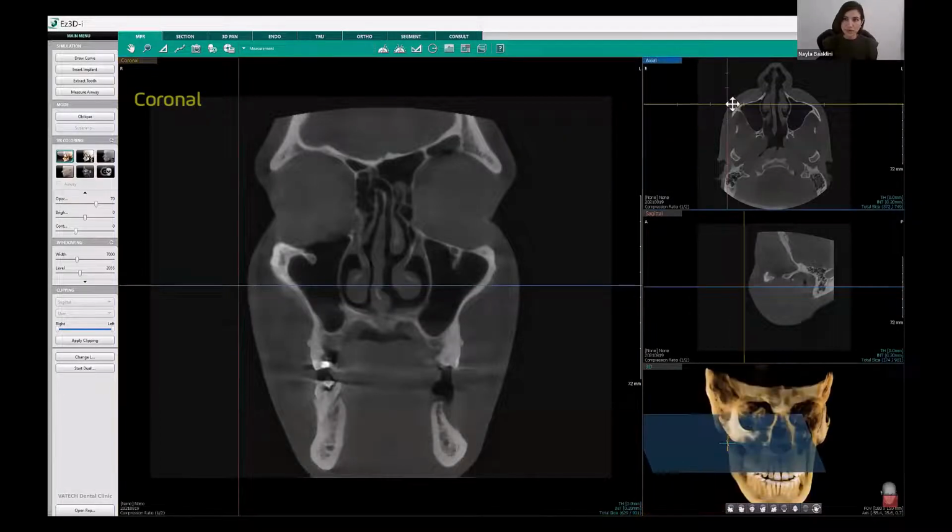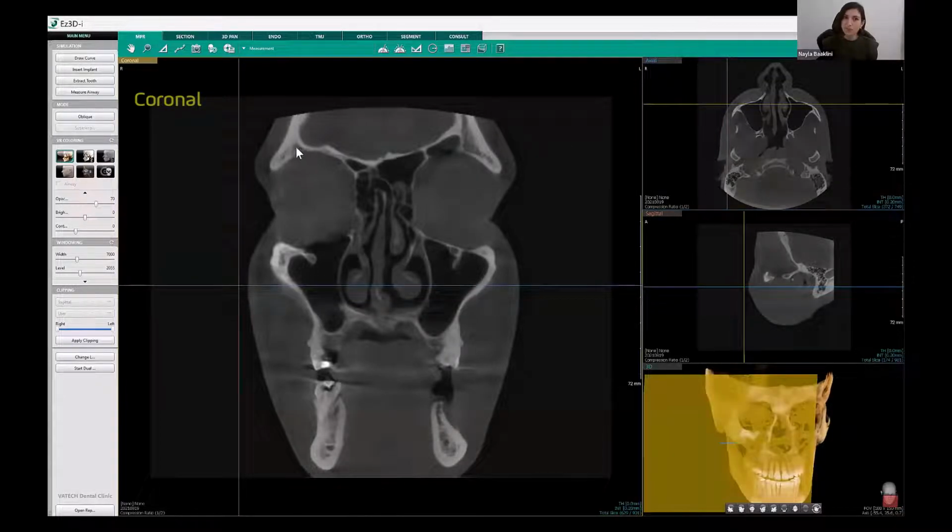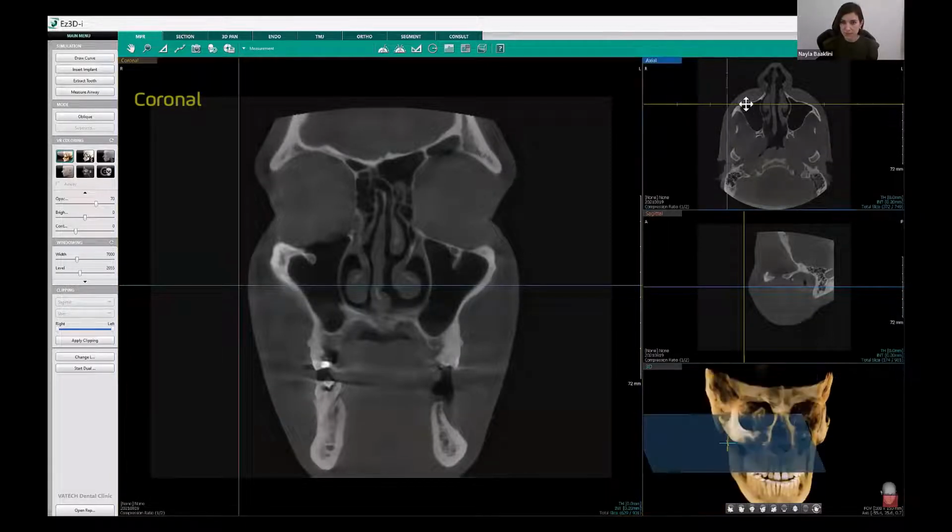So when you look at the osseous structures, we have to look for intact cortices, for a trabecular bone pattern which is within the range of normal, for symmetry, for no expansions, let's say no low density areas or mixed density lesions.